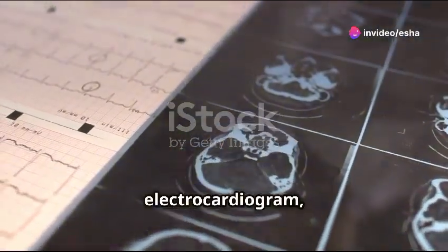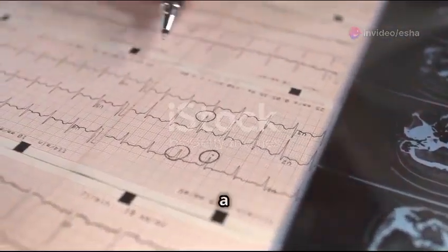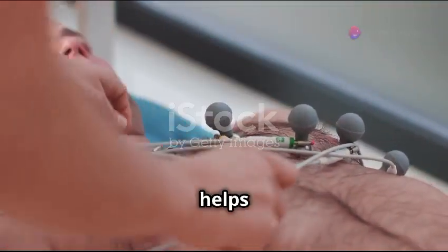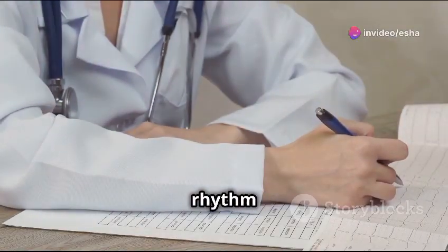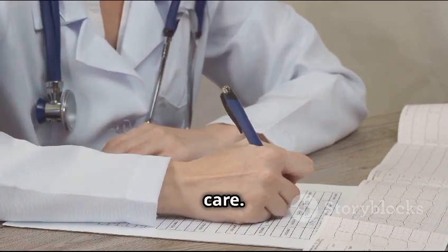The electrocardiogram, or ECG, is a fundamental tool in modern medicine, providing a visual representation of the heart's electrical activity. It's a painless, non-invasive test that helps healthcare professionals diagnose a wide range of heart conditions. From detecting heart attacks to identifying rhythm abnormalities, the ECG plays a crucial role in patient care.